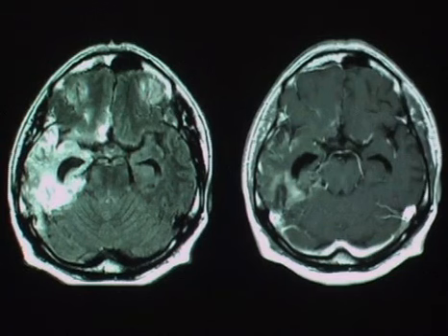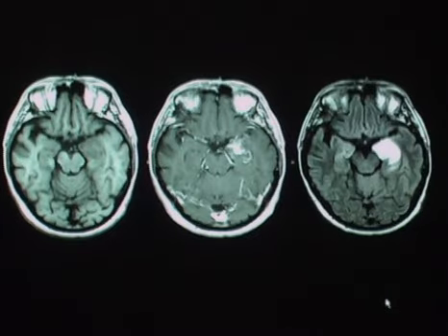A couple examples of this: a fairly florid case of disease with extensive signal abnormality and enhancement involving the near entirety of the right temporal lobe, but also involving basal aspects of the right frontal lobe as well. We've got some patchy enhancement here in the post-contrast imaging. Here's a less prominent case, but still well visualized. On the pre-contrast imaging we see some mass effect and hypointensity. On the post-contrast imaging, vague and irregular enhancement in this region, and prominent FLAIR signal abnormality.